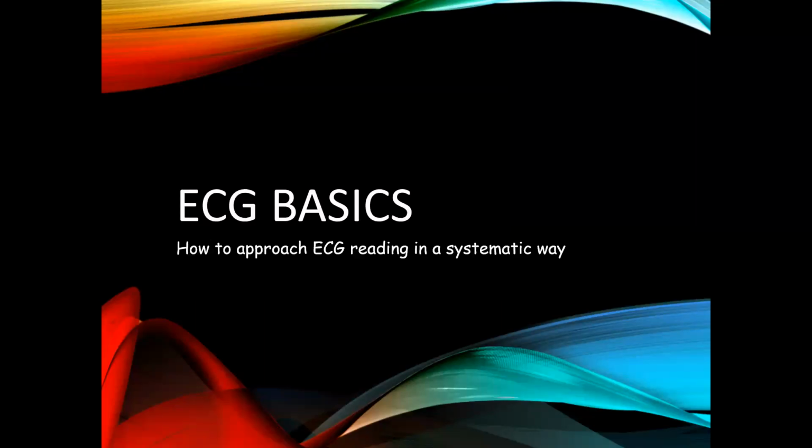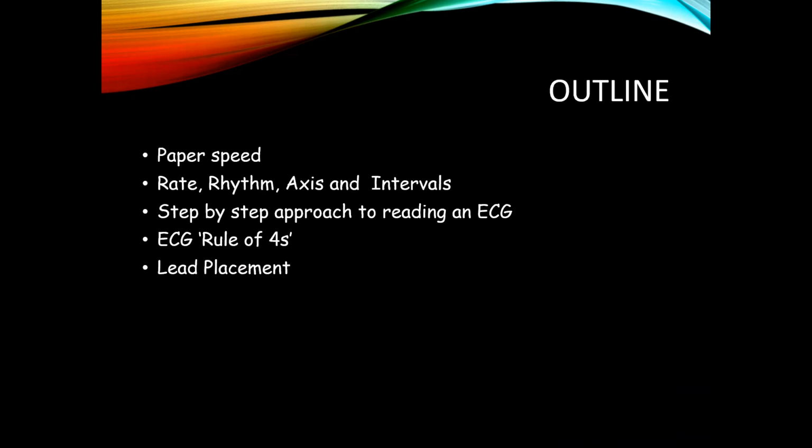Hello everyone, today we'll be talking about ECG basics. We're going to discuss how to approach an ECG reading in a systematic way. So the outline of this video is we're going to look at the paper speed, rate, rhythm, axis and intervals of an ECG reading, a step-by-step approach to reading an ECG.